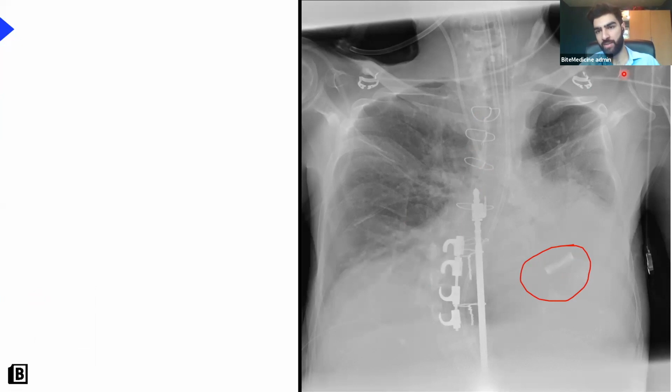What are these wires here? These little clips on the shoulders. So these are ECG leads, okay, or cardiac monitoring leads. So these can be like 3-lead ECG. Other lines, they've got an NG tube running down the midline. They have another line here going into the superior vena cava. So it's coming in through the internal jugular vein. So that looks like a central line, okay?